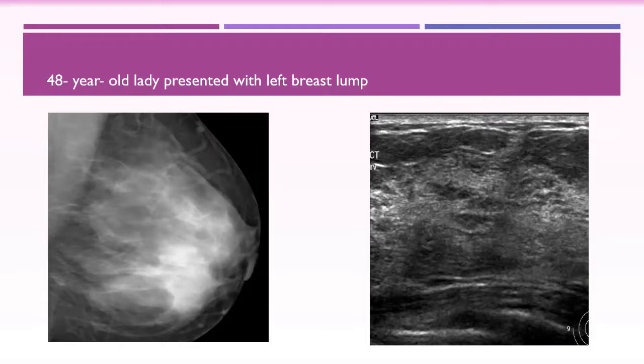So, tethering. Yes, causing tethering. This we call an element of fibrotic changes, but not like that of the extensive stromal fibrosis. But still, it is an element of fibrotic changes, usually seen in fibrocystic change. We call it a fibrous ridge. It is a very, very common cause of palpable abnormality.